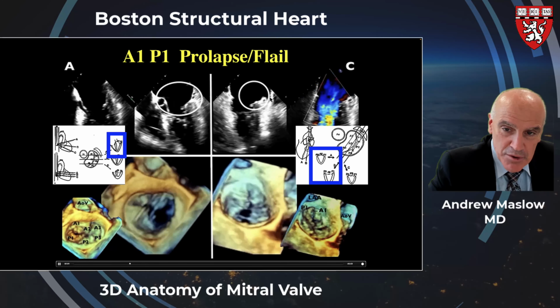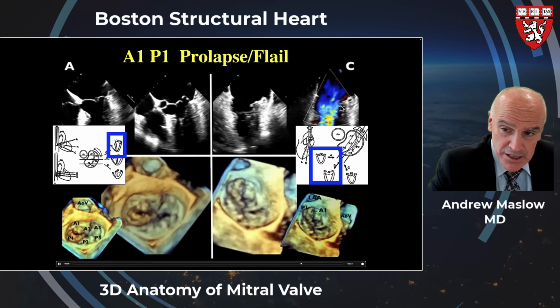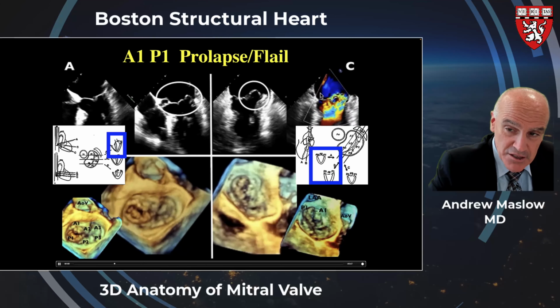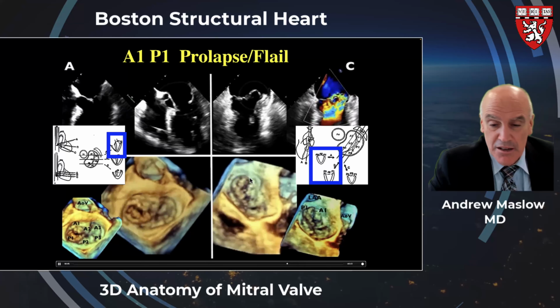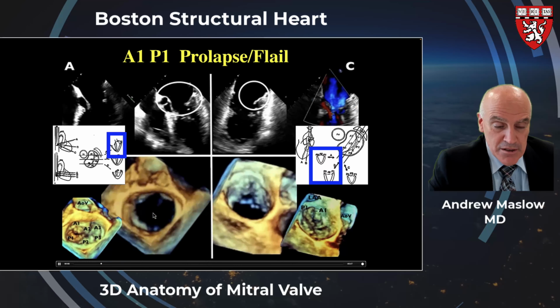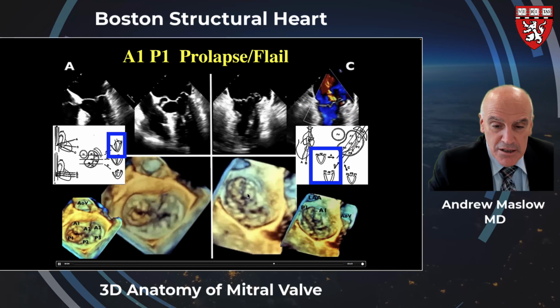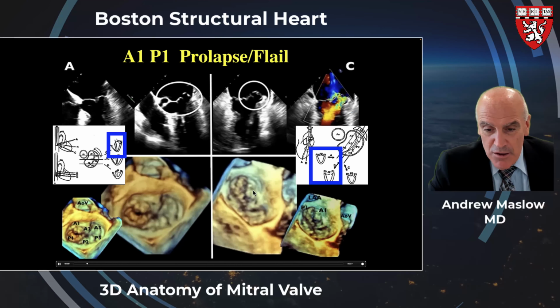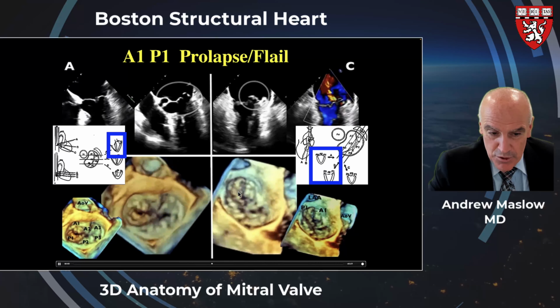And you can identify that in part because there's a little hint of the left atrial appendage. The regurgitant jet itself is fairly eccentrically directed away from the flail P1. On the three-dimensional view, to the left and then also to the right, and the right's a little bit rotated just to show the combination of the A1 and P1 prolapsing or flail tissue.